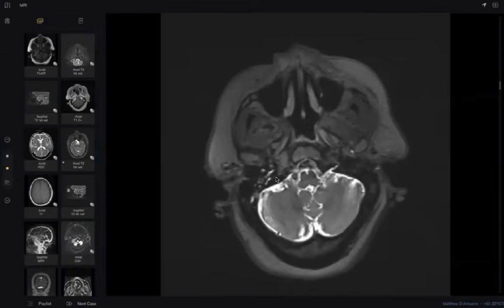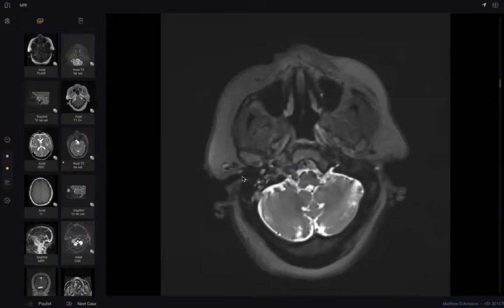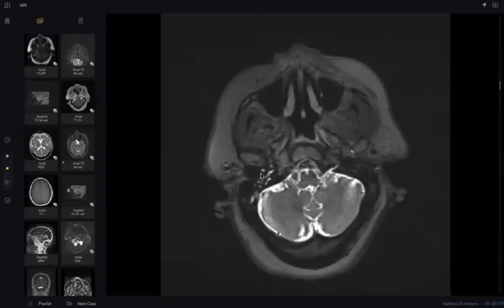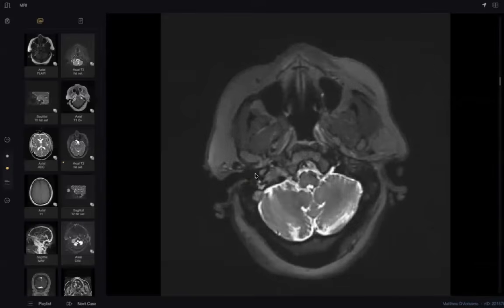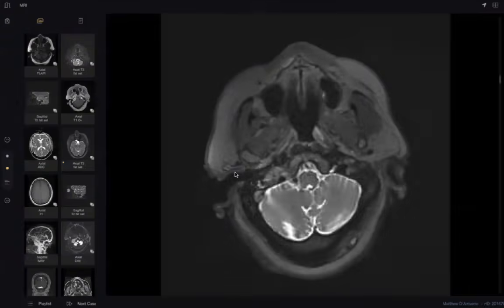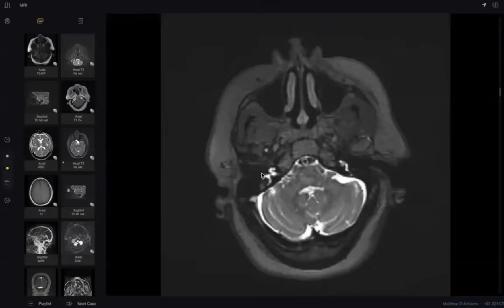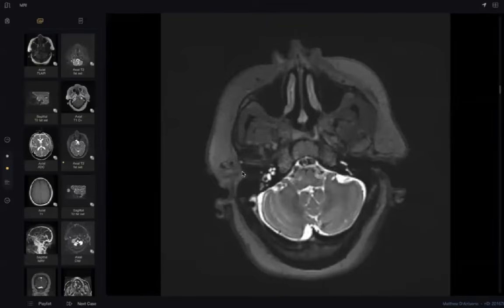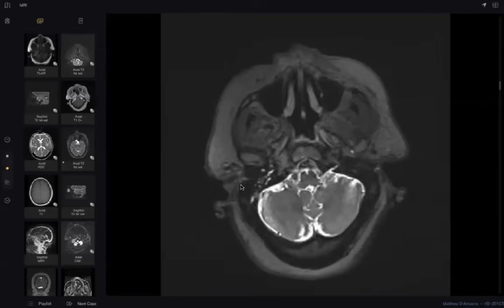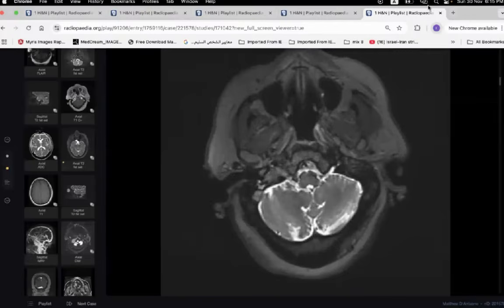So here is the level of the ear. By location, this is the middle ear, and this is the external ear. Where is the lesion? The lesion is at a lower level. Why? Because the nerve is here and the labyrinth is here, so we can't detect any lesion. We must go down many slices; the lesion starts below the ear level. Thank you, doctor, so much. Next candidate.